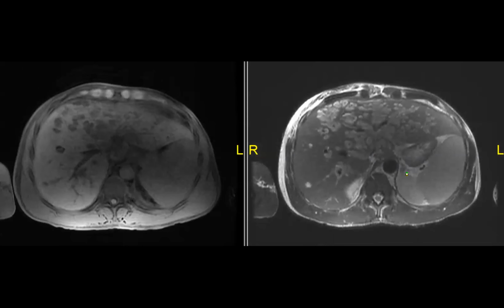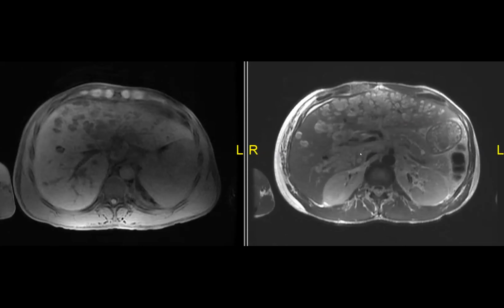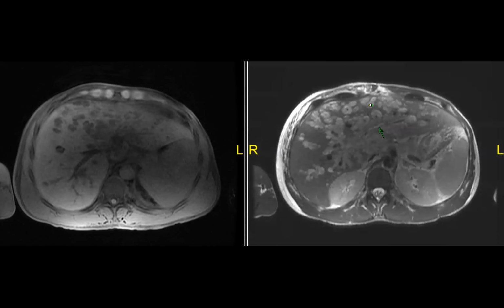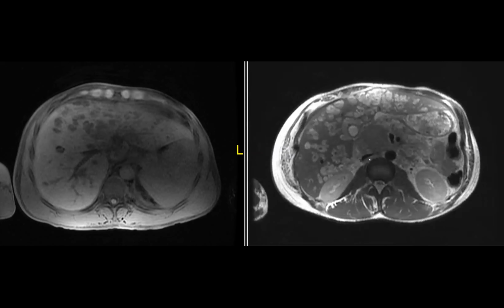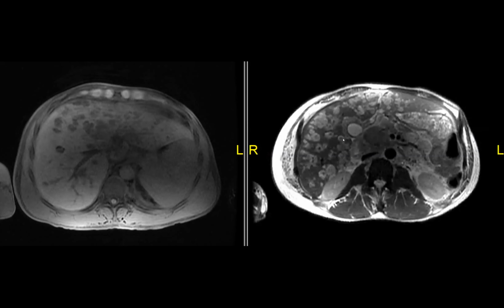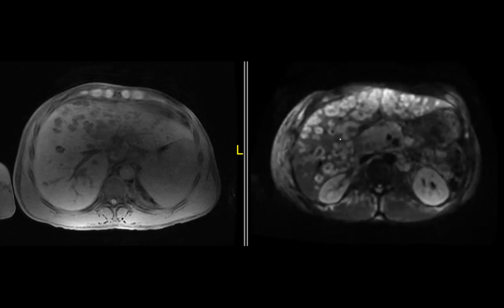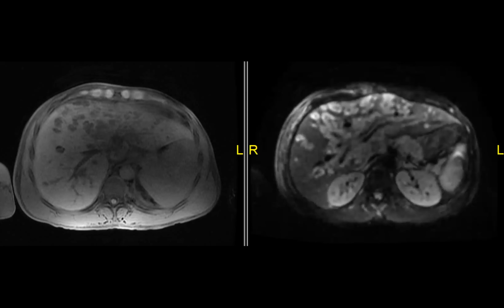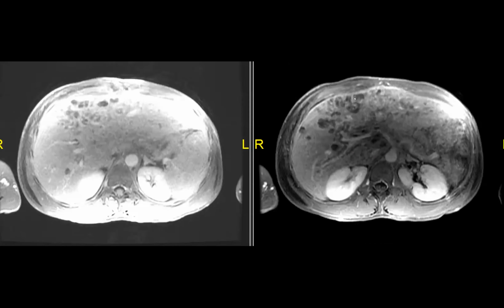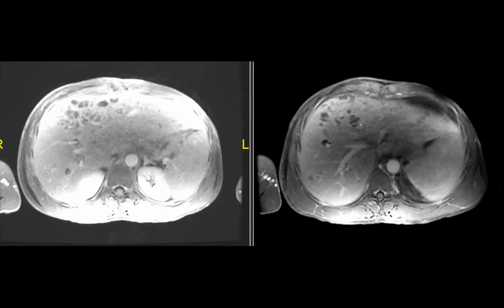It's the evil gray of tumor that Aarti loves to talk about, right? You can see how much brighter. There's something crazy going on in the pancreas too. Yeah, and you can see it's really restricted diffusion. Anyway, so this had to be biopsied, right?